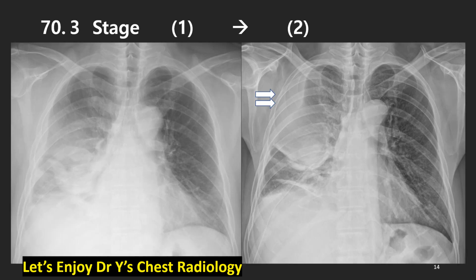This third case shows us what will happen if we do not hasten, if we hesitate for the diagnosis. On the left side, it is uncomplicated pneumonia with parapneumonic effusion, but it went to the right side shapes. That means loculated pleural fluid on the upper side in this erect PA view, against the gravity law. That means the upper fluid is loculated, pocketed, and complicated.